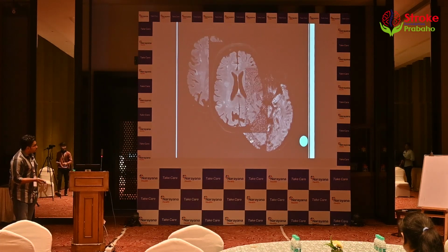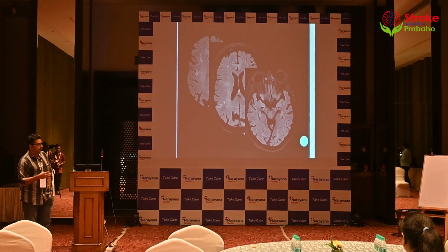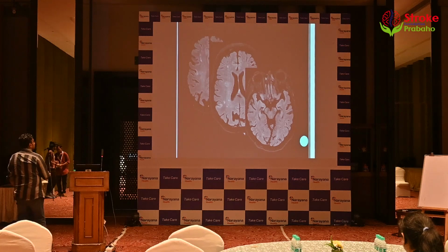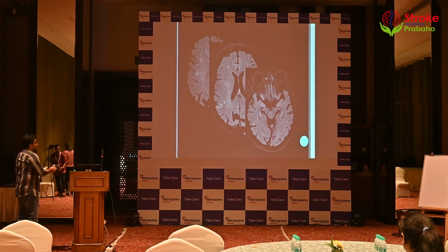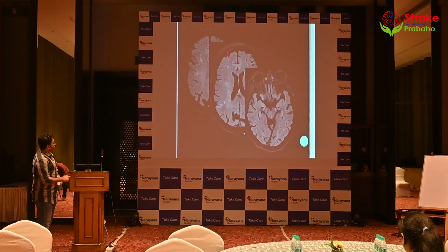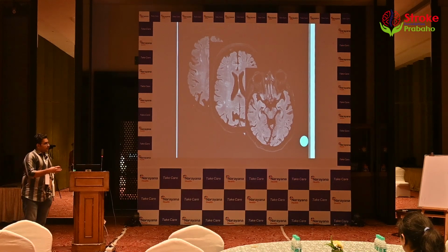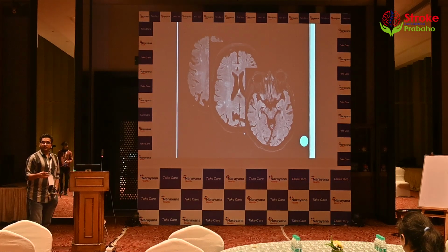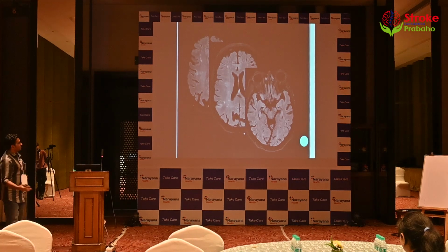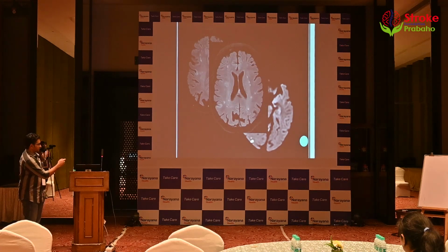So what else? We would now start doing all these diffusion FLAIR mismatch. I don't know how many of them are serious about lysing based on the mismatch. And this is right up my ballgame. I'm very confident in dealing with doubts here. How many of you are saying there is a mismatch? And how many of you are saying there is no mismatch? Yeah, I need both sides here. Come on, there are two sides to the coin. Diffusion again. Seriously, you really want to say there is a mismatch in this region?